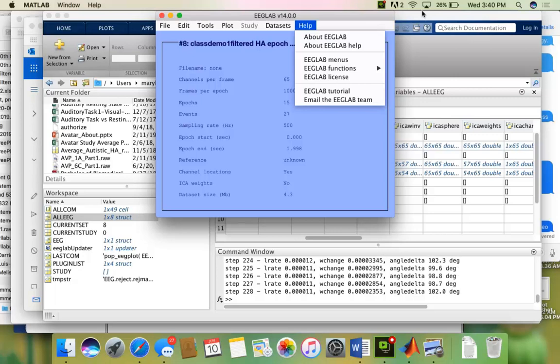You could also see if there's a difference per emotion. So you can do a comparison between a happy avatar and a sad avatar, and you can do a comparison between a happy real and a sad real. And you can actually do a two-way comparison using what's called analysis of variance. So there's a number of different kinds of comparisons that you can do.